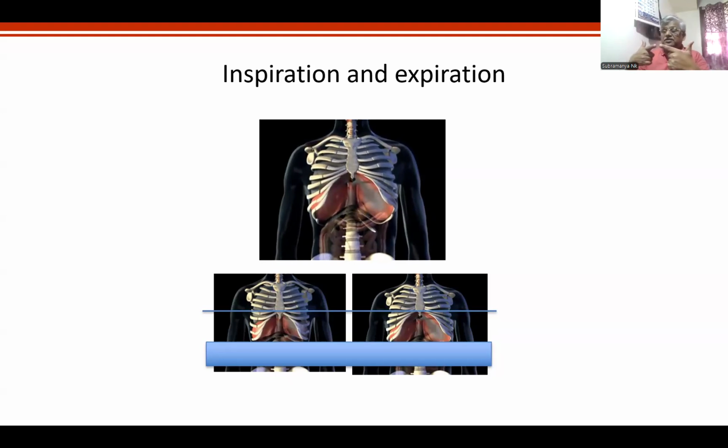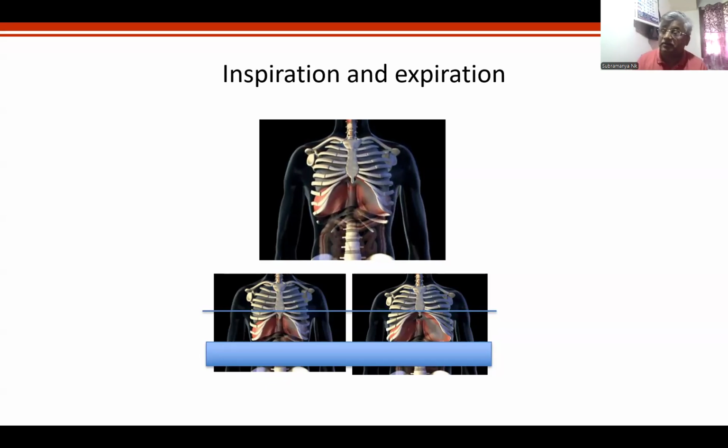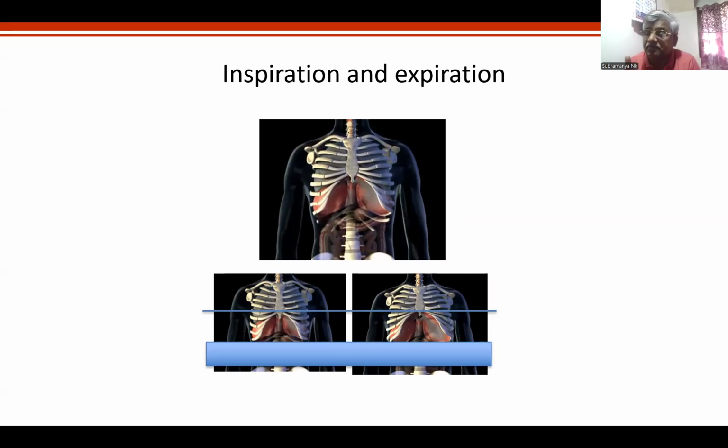See, when you have two images, it is easy for you to make an interpretation. Don't interpret the lateral alone. See the lateral and AP, AP and then lateral, lateral and then AP, and correlate. Please, all of us don't correlate. Like you have rotation in an AP, you also have rotation in the lateral. It won't be a perfect lateral. Did you understand my point? So therefore, you must take a lateral X-ray.